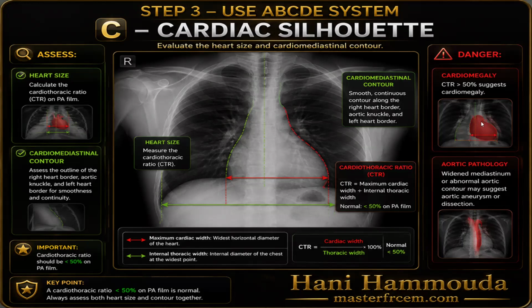So, heart, how to know it's a cardiomegaly? We mentioned already. More than 50%. Aortic rupture, whether traumatic or non-traumatic, shows a wide mediastinum. If the widened mediastinum is non-traumatic, it means aortic dissection or rupture. If traumatic, it means aortic injury. Easy?